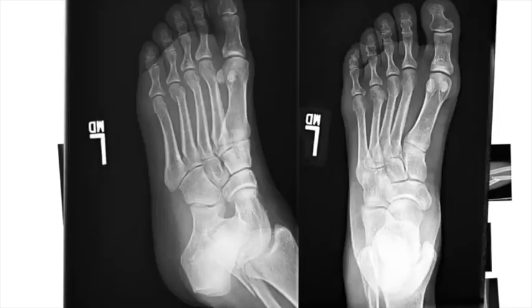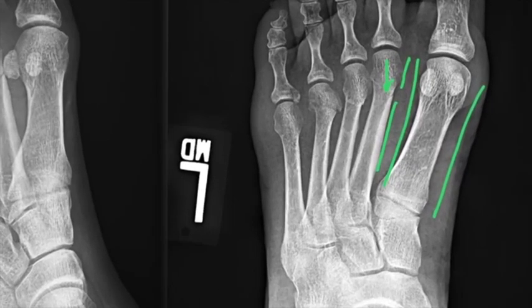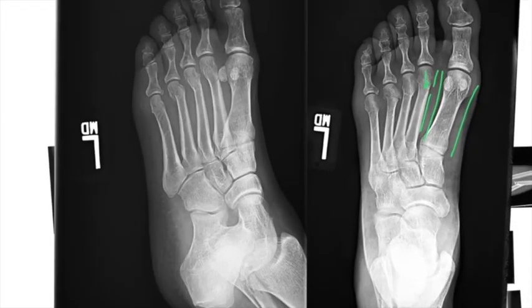We're going to use that same technique that we just talked about, and we're going to look, okay, smooth, smooth, and then you go right here, maybe not smooth. Take a closer look at that. Then, not smooth. Okay, definitely not smooth. Not smooth. And those are fractures. Smooth, smooth. Oh, you get that line there. Not smooth. That's a break in the cortex. Not only is this not smooth, but it's not aligned normally. And then, of course, not smooth and indicative of fractures.